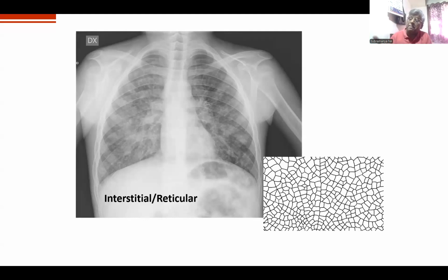But remember that in bronchiectasis also, you see a dilated bronchus and a vessel, the signet ring appearance. That is because the bronchus is dilated. It appears in bronchiectasis like a round shadow or a parallel shadow and a ring. That means there is more air. The dilatation of the bronchus in bronchiectasis gives you more air. That's why you call it bronchiectasis. You can see dilated airways. You understand? That is what I meant by air contrast.